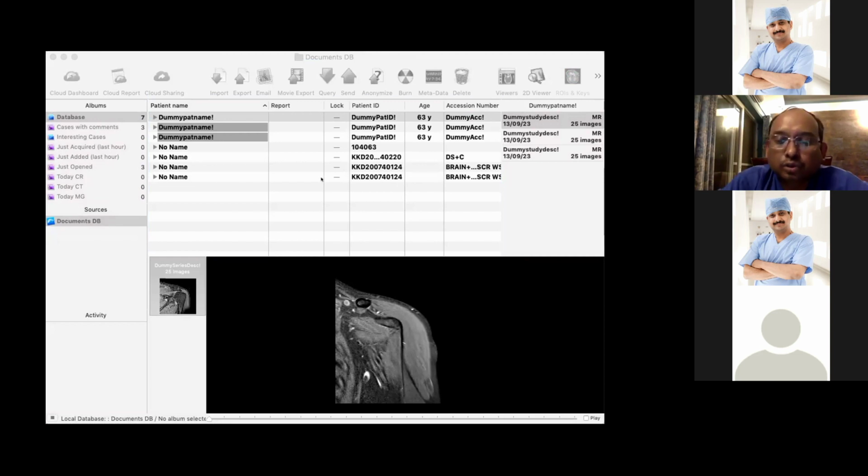Okay. So in MRI, as I told, there are various sequences to assess different joints and different structures. In musculoskeletal imaging, there are four sequences which are very commonly used. One is what we are seeing on the screen, the proton density fat suppressed image. I won't go into the physics, but I will tell you some signs to identify a specific sequence, what structures to see in that sequence, and how pathologies can be seen.